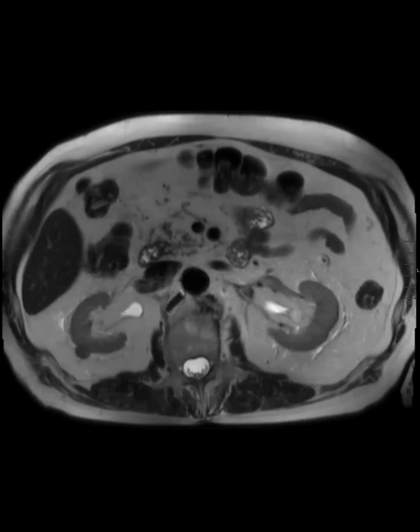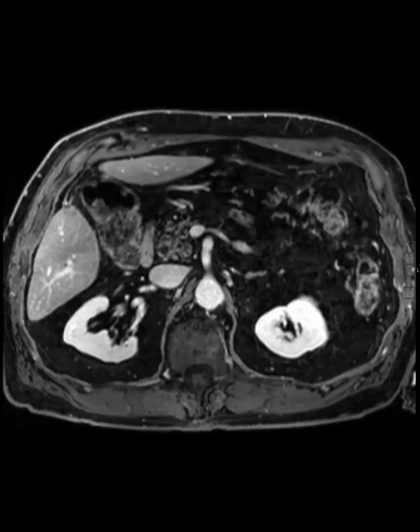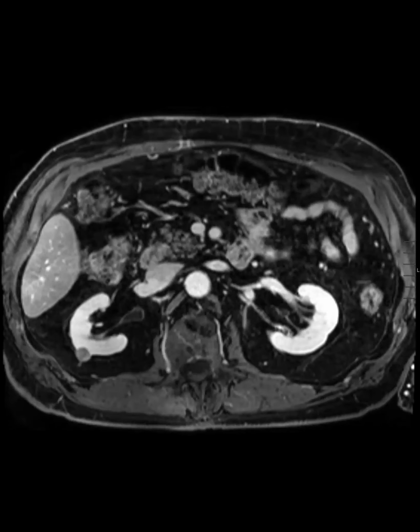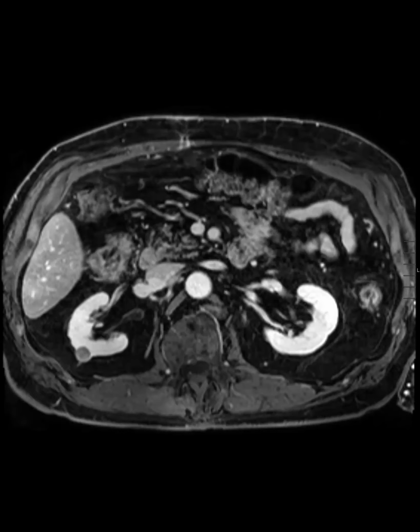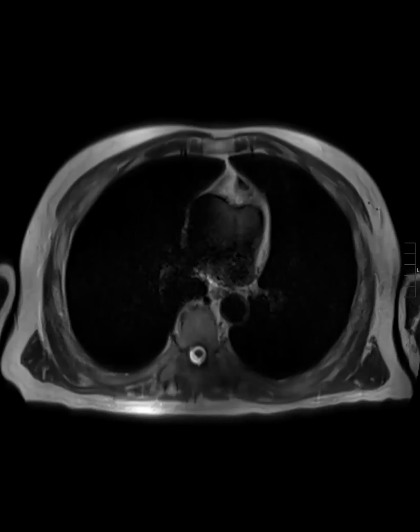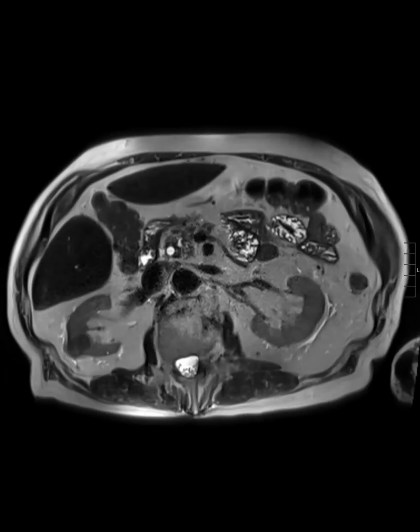So this is a year later, very similar appearance. Here's our post. T2 dark there, right? There's a little bit of something in there. And then this was a few years later. We've been doing regular surveillance. A few years later, we have this one. Now it's getting bigger, just very slowly over a course of multiple years on active surveillance.